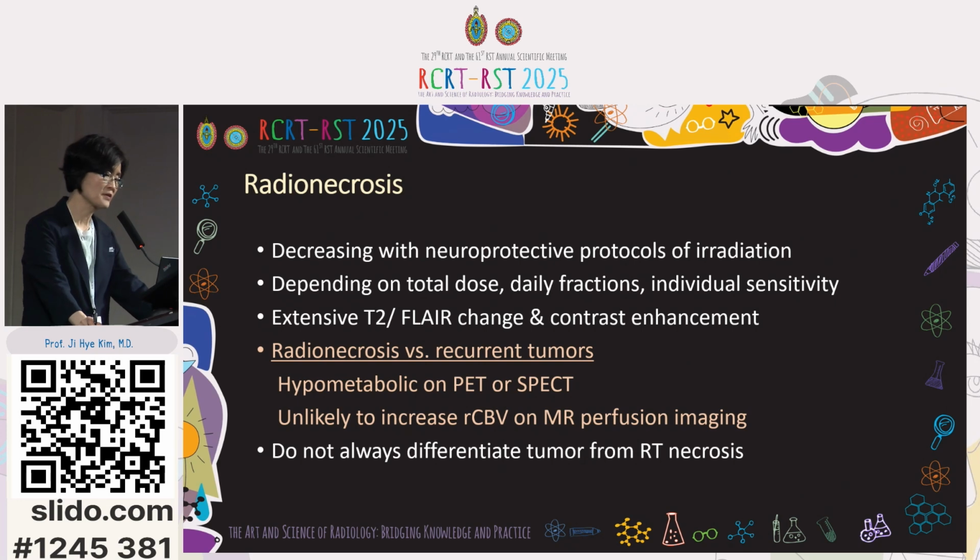Radionecrosis is decreasing with the neuroprotective protocols of irradiation. However, depending on the total dose, daily fractions, and individual sensitivity, RT necrosis should be taken into consideration when making a diagnosis. The imaging findings are very similar to the viable tumor, but RT necrosis shows hypometabolism on PET or SPECT and decreased perfusion on perfusion images. However, even these advanced techniques do not always differentiate tumor from RT necrosis.